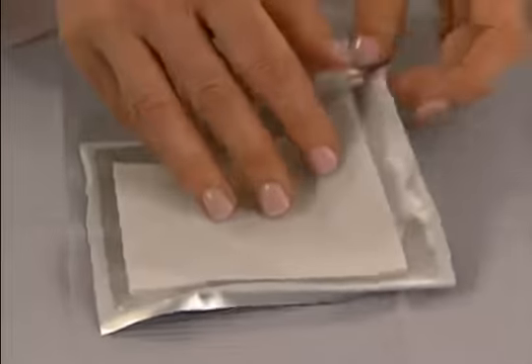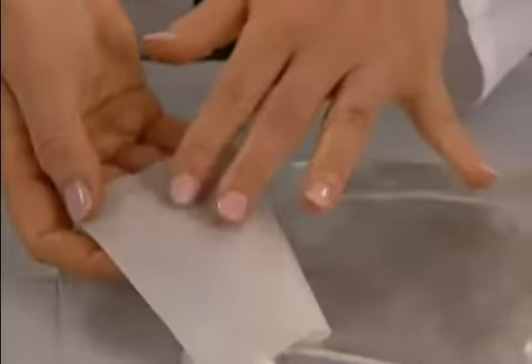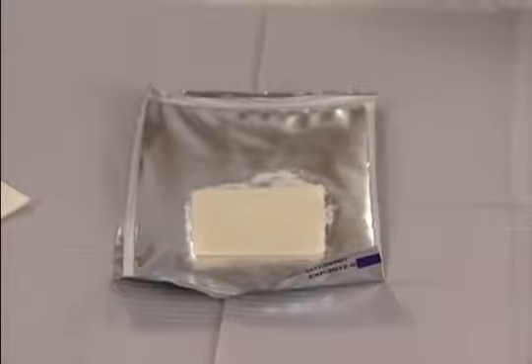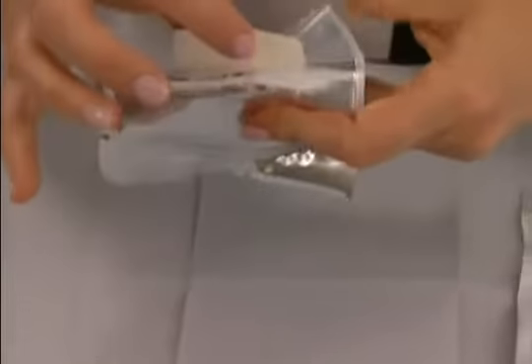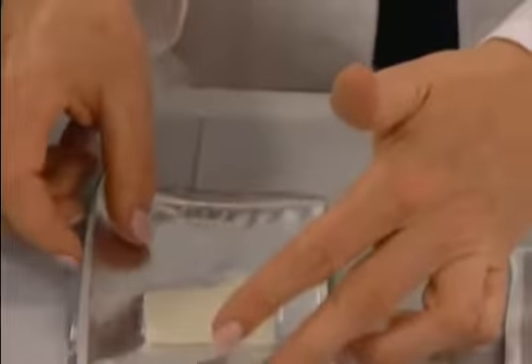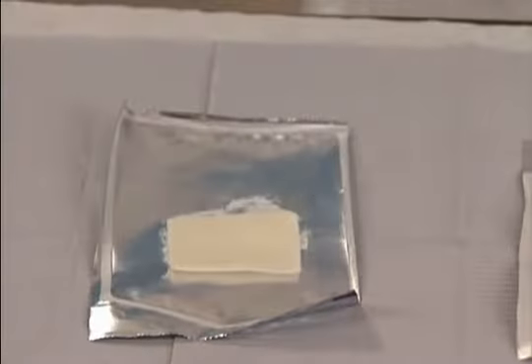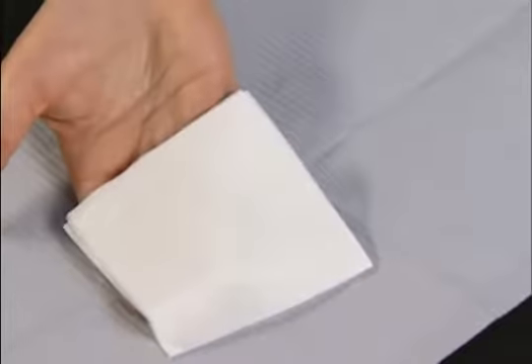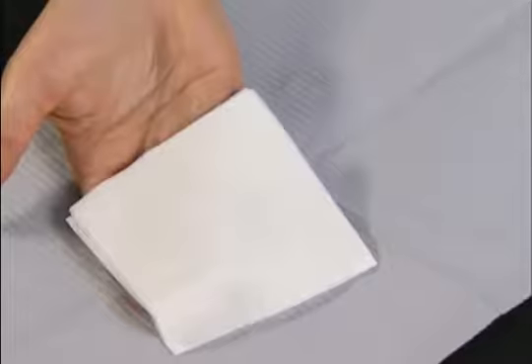An impregnated gauze is infused with a substance that aids healing, such as an antiseptic, hydrogel, or a hypertonic saline solution. This type of dressing is used as the wound contact layer and requires a secondary dressing. Antimicrobial impregnated gauzes, such as silver-infused pads, are often used on burn victims to prevent bacterial infection. Hypertonic saline impregnated dressings are infused with sodium chloride, which wicks moisture away from wounds with excessive exudate.